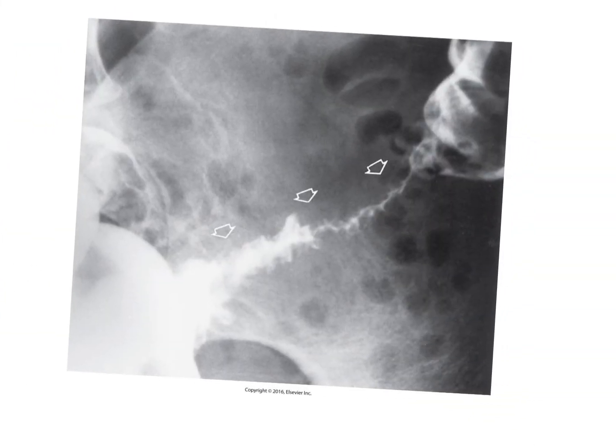Now on our next x-ray, I just brought it up so that you can compare. Now where we have diverticulitis. So now we have that itis ending on our word, and we can see that it looks quite a bit different. Here it looks like the condition has eaten away at the bowel for this one.